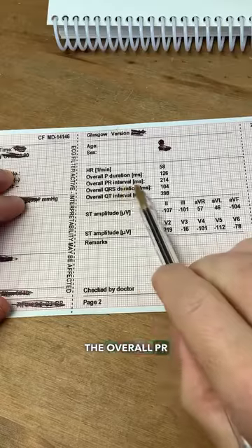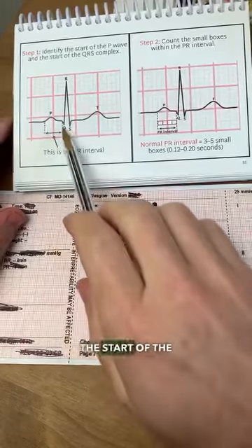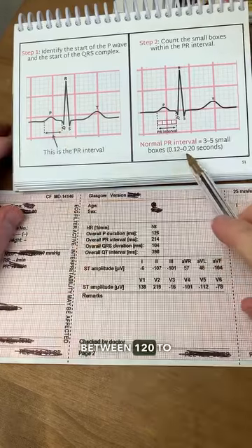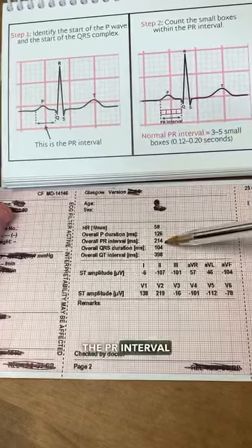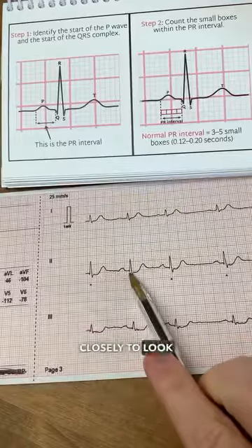The overall PR interval refers to the distance between the start of the P wave and the start of the QRS complex. This is classed as normal if it's between 120 to 200 milliseconds. So looking at this, I can see that the PR interval is slightly prolonged, prompting me to assess this interval more closely to look for a likely cause.